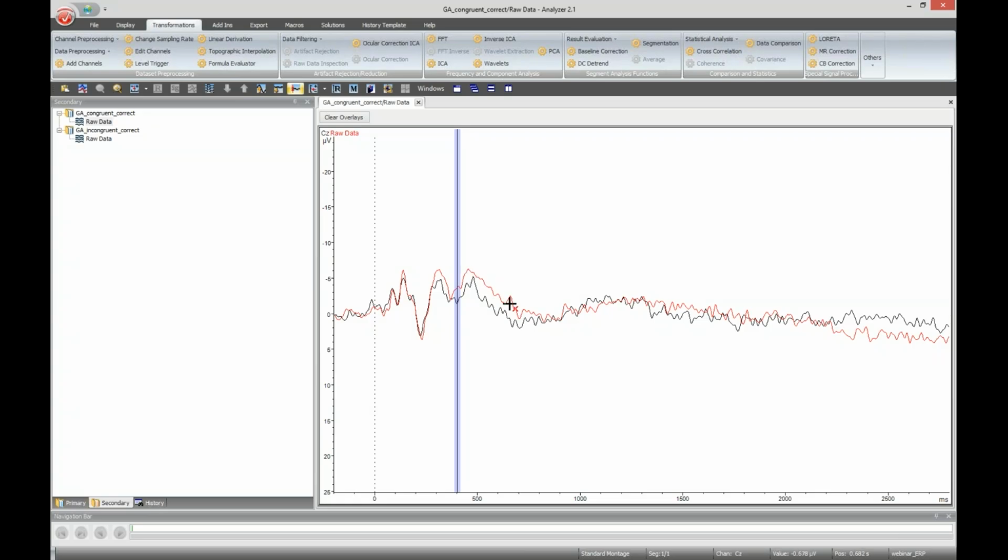So this is what we would have expected. It can also be that this effect is lasting longer. It can also be that this difference later here is due to other ERP components that come later. We don't know that yet, so this would require much more interpretation and thoughts. But let's not interpret too much here, because you know this is just 4 subjects averaged. So probably this will not yield any statistical significance yet. It's just a too small sample size. But it seems like our experimental results point in the expected direction, so we are on a good way. Okay, that's actually what I wanted to present you today from a content perspective.